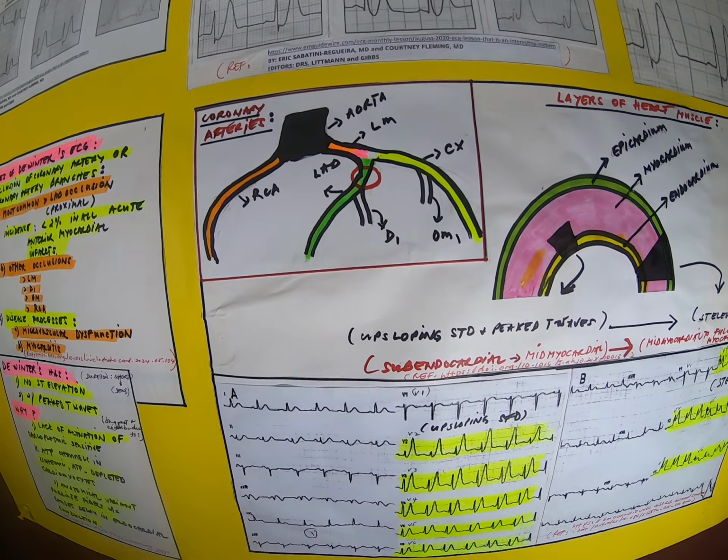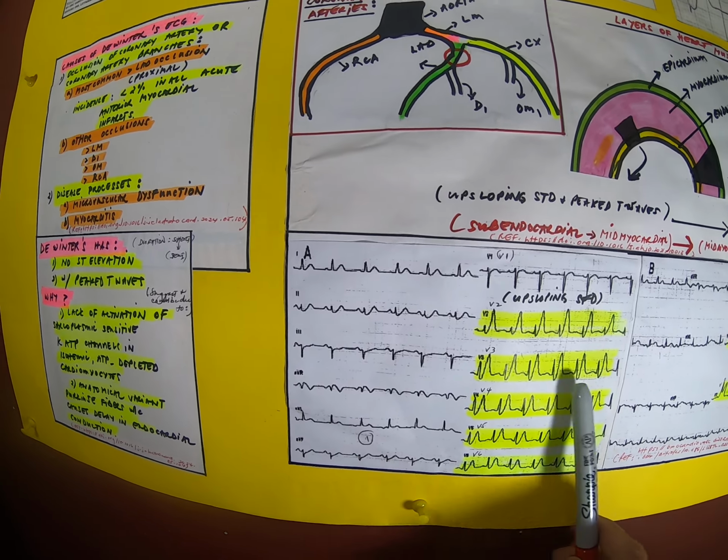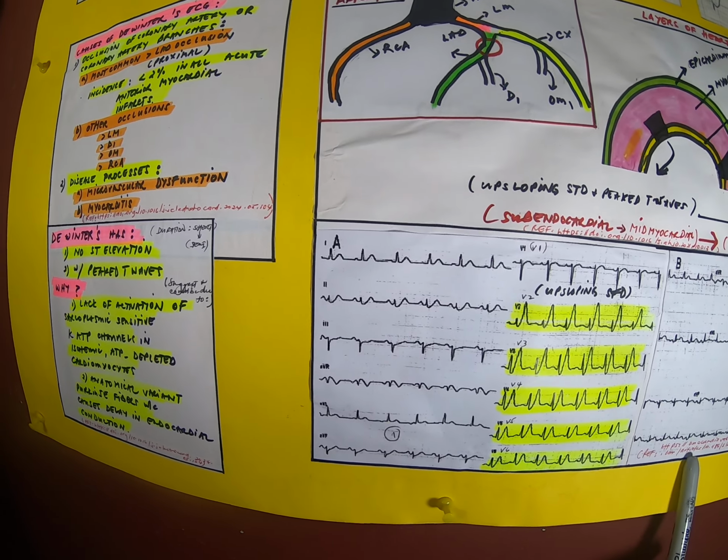We admitted a patient with de Winter's before, but it was a very busy night. I didn't have a chance, but the doctor showed us de Winter's, and I said, oh, I've never seen that before, so I'm interested. But anyway, too late. I didn't have a chance to go over it. But anyway, I'm presenting it now, so I got this reference and got these ECGs. Okay, this is the reference here.